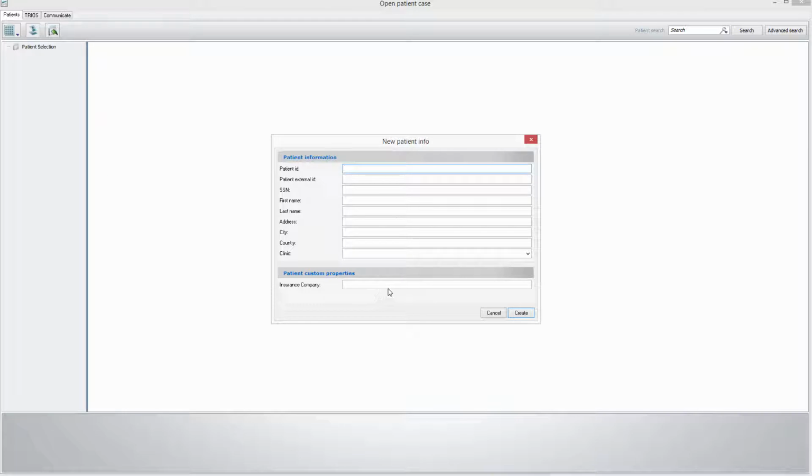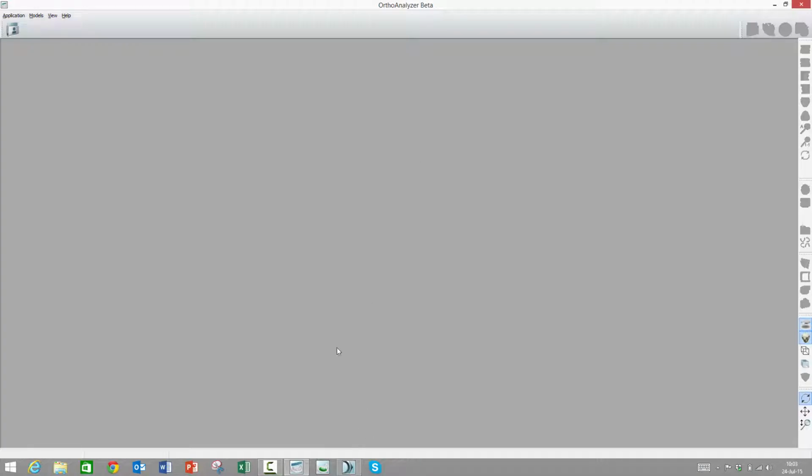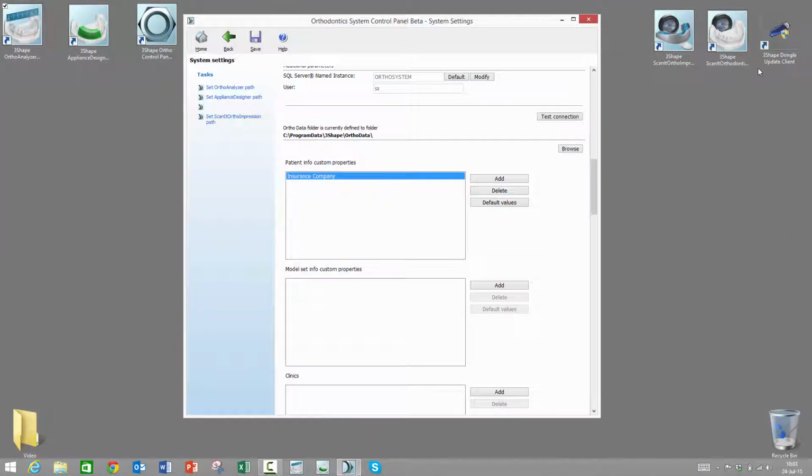You can do a little bit more advanced things here. If I go back to my control panel, I can add some default values in those drop-down fields. As soon as you have added a custom field, this button called default values becomes selectable. If you click there, you can enter some default values that will create a drop-down list. This will make sense in a second.